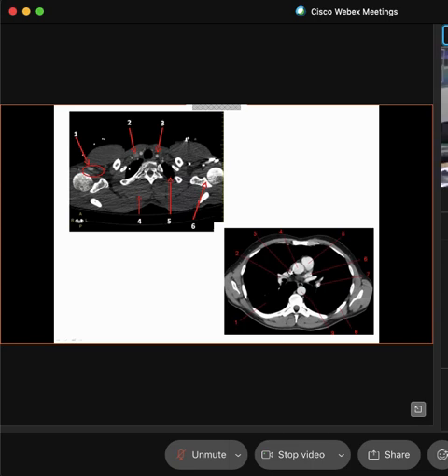Javier, which one is this one? Which one lies more superior? Is it this one or this one? They're both thoracic images. This one or this one? No, that one, the bottom one. This one lies most superior because you have more bony anatomy in the form of humeri, right? We have less lungs. And here we have a great deal of lungs.